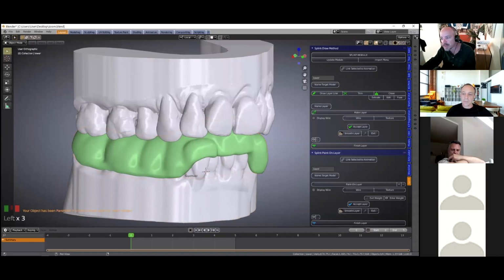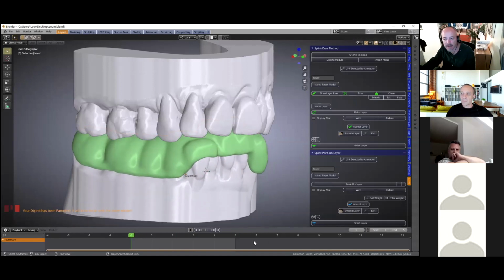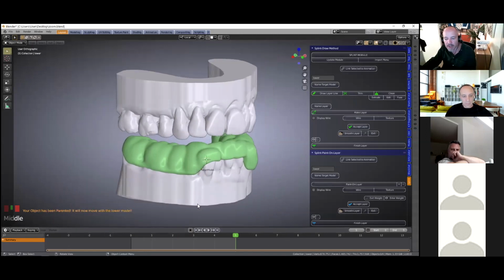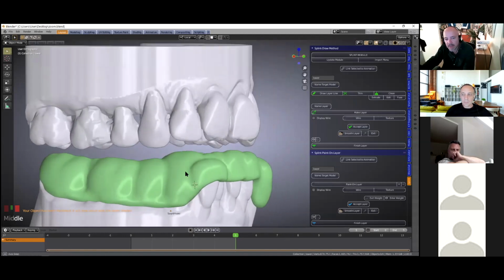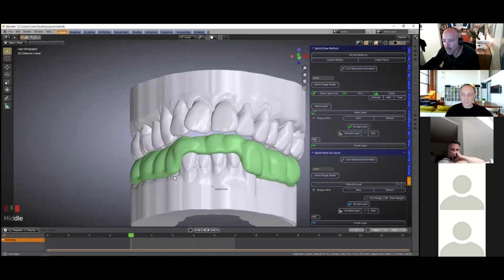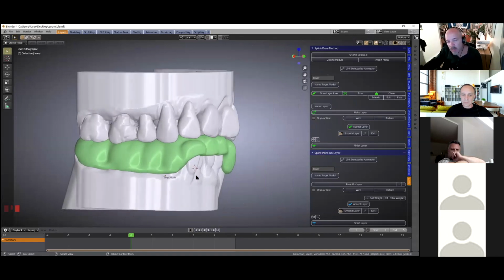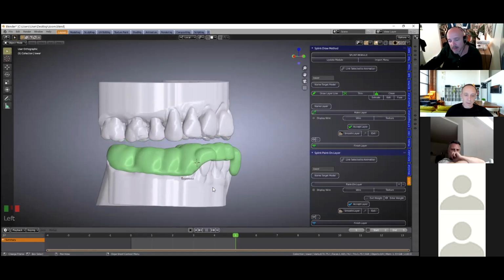We've got a few of these buttons around, so as soon as you do that, it links to the animation. So the next thing is, we've opened it, but we can decide how thick we want the splint to be. Where shall it disengage? We can cut it like this and have small little indents, or do we actually want a gliding surface? So let's put a rim in here.